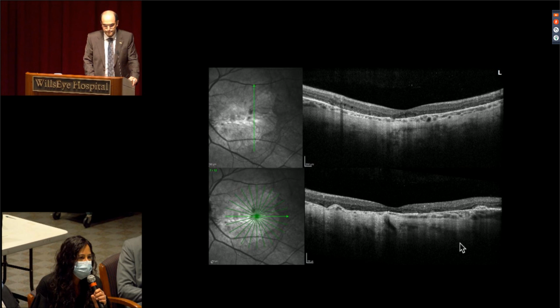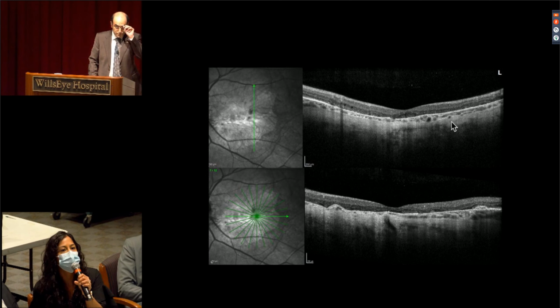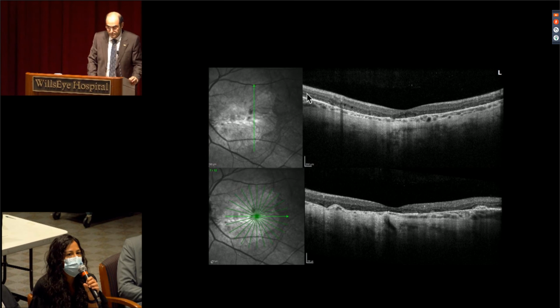And then here we have the left eye. Similar findings, but not as severe. So, there's a nice, well-preserved, vitreous is clear. There's some opacities here. I don't see the hyaloid down for sure. And then the inner retinal layers look fairly well-preserved. But then looking at the outer retinal layer, so looking at the outer nuclear layer, we see these kind of small cystic changes.